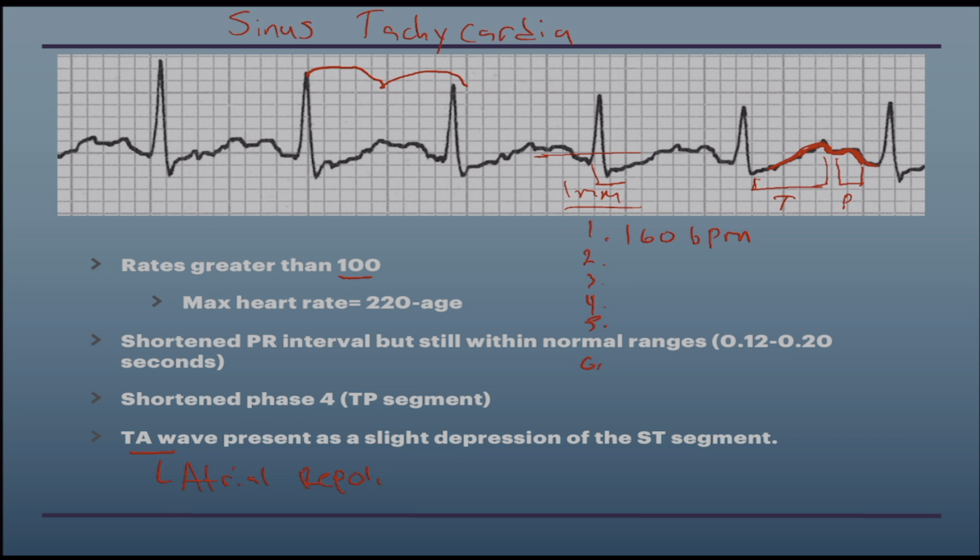Next thing I would ask myself is, is it regular? Well, it actually looks very regular. It's pretty consistent. I would march it out again, but I'm going to go with this is a regular rhythm.